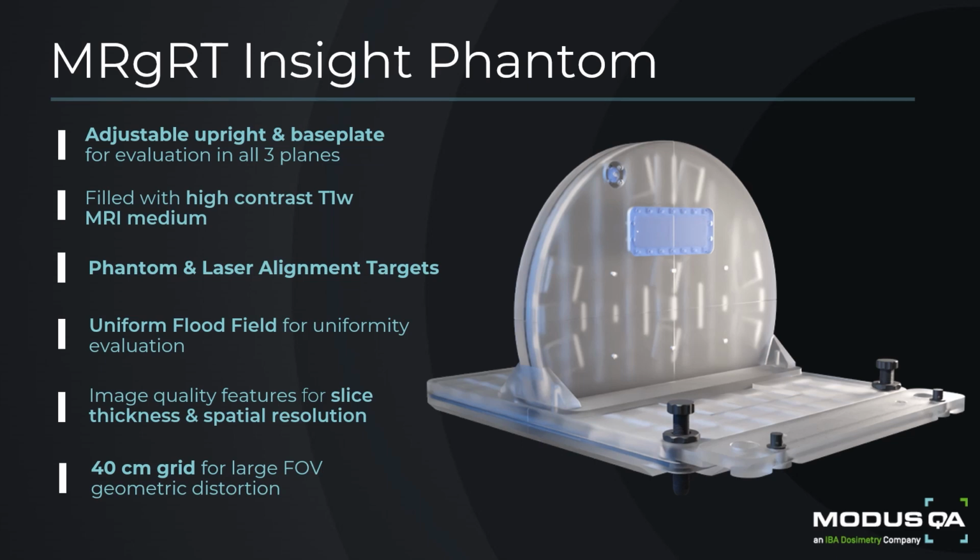To supplement this, each of those structures is also filled with a highly contrastive MR contrast solution, which significantly enhances the Phantom's image resolution during scanning, thereby making the internal grid and the landmarking options far easier to visualize and analyze. And this is occurring even at low-strength magnet systems at 0.35 T. So far we have validated that this Phantom does perform well on dedicated MRI systems from 0.35 T all the way to 3 Teslas.